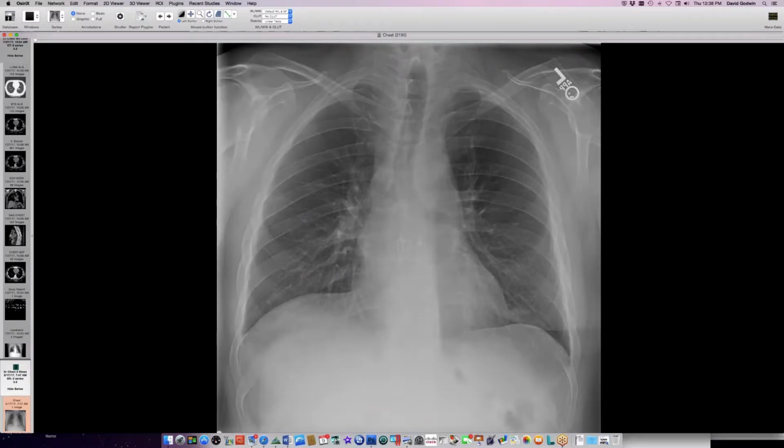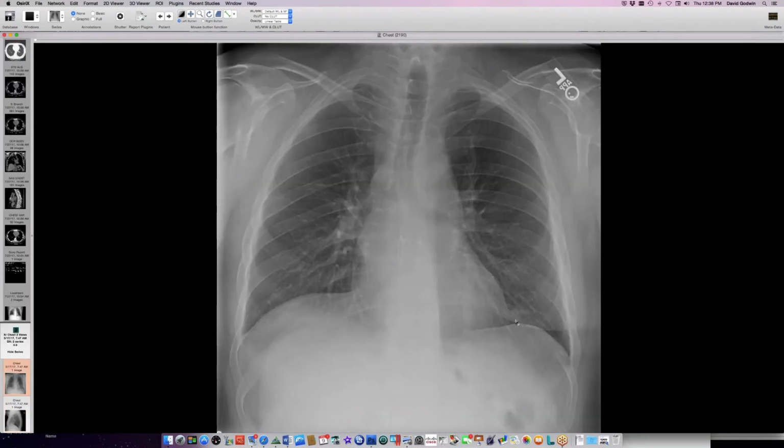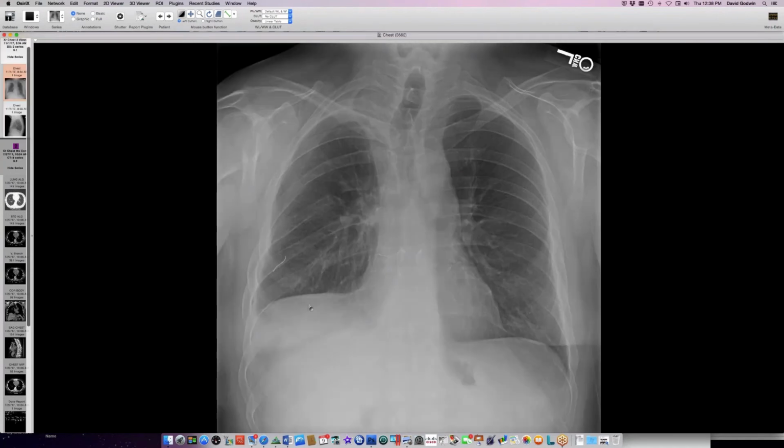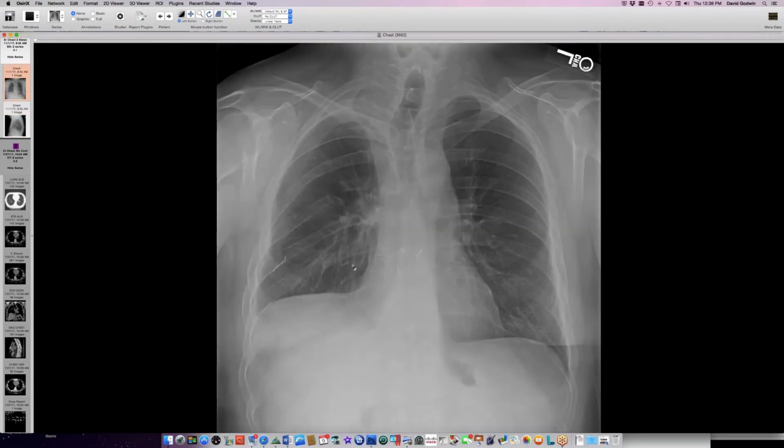Okay, and this person had lung transplant, and keep your eye on these transverse sternotomy wires at this point. At this point, the lung volume was a bit low, but the lungs are pretty clear, just a little bit of basal atelectasis. And then later on, we have this radiograph, and at this point, notice that the sternotomy wires have fragmented, and there are actually some missing portions here, but we can find the missing portion out here in the right lower lobe.